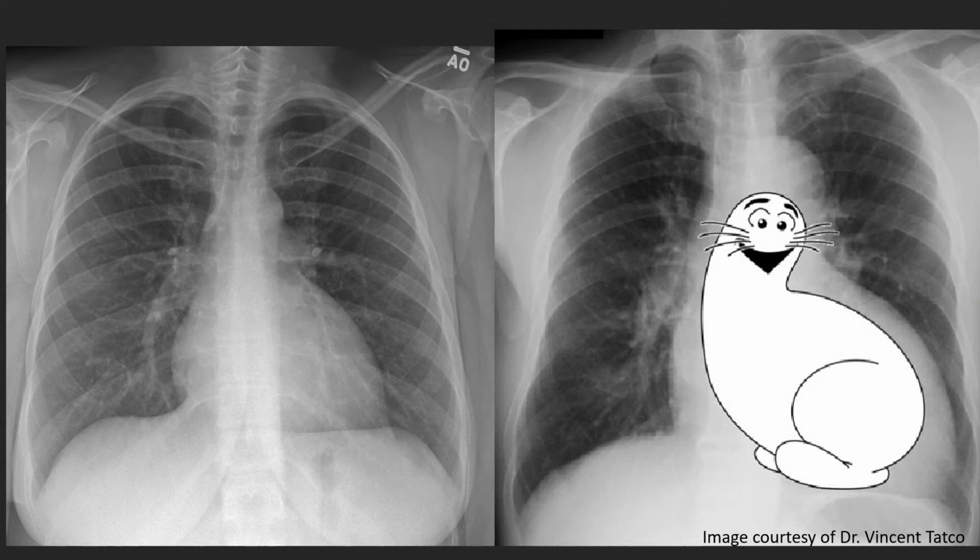The appearance of a downsloping and prominent left ventricular border has been likened to a shmoo, a fairly creepy appearing cartoon from the early 50s, one that's been haunting my nightmares since I learned of this sign. This is what's known as the shmoo sign.